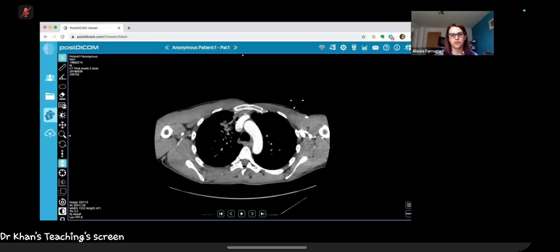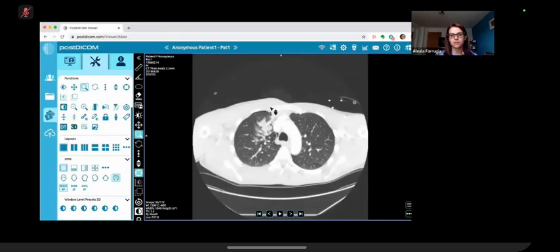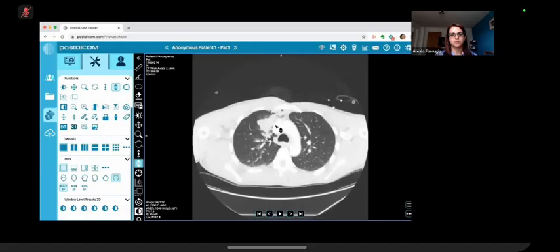So these were areas of lung contusion, and there's disruption of the lung architecture because of the laceration, of course. But there's no active bleeding into the area, so there's nothing to embolize really at the moment.